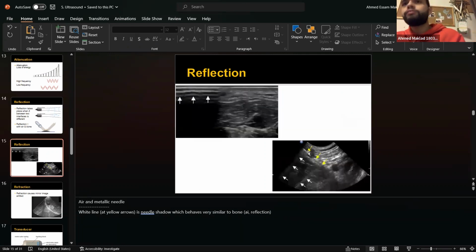What is the needle for? It's probably a diagnostic or a treating process. So for example, a fine needle aspiration, this is an ultrasound guided biopsy, an ultrasound guided procedure, right? That's when we use needles.